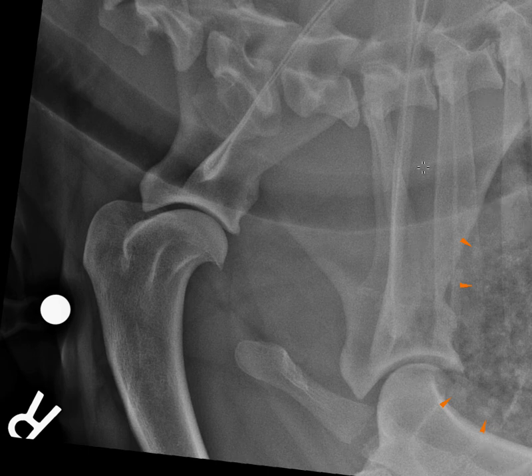But as an important finding, we have concern for increased opacity in the lungs, but this is incompletely characterized and warrants further assessment. I'm very concerned that this pattern could be nodular in nature, but 3-view thoracic radiographs would be warranted to help, first of all, confirm the lung pattern indeed as being nodular, to look at its distribution as to whether it's diffuse in the lung or isolated to a certain part of the lung, and look for concurrent pathology, which could include lymph node enlargement, cardiomegaly, pleural fluid, for example.